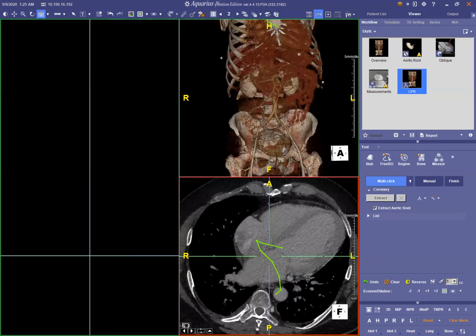All right, so once I have that, I just hide all the labels for now and then reset the orientation like so, and then use the batch tool to send a 180-degree rotation of what I have right now in the curved planar reformatted images. So 24 images and then 180-degree, preview that, make sure everything is staying within the window, output that.